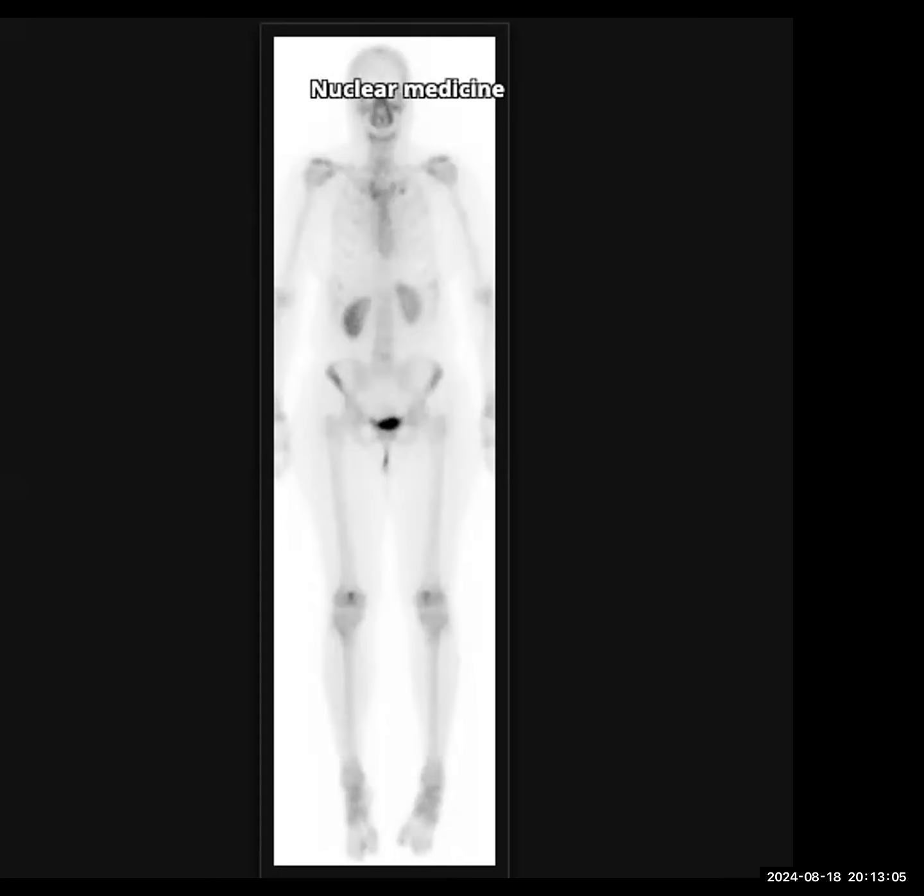That could be osteoarthritic changes. I can also see mild uptake within the iliac bones bilaterally. There is a small uptake that I see in the left-sided rib. Is this the same patient? Yes, no, it's a different patient. Okay. So I see a small uptake within the apex of the left hemithorax. You can ignore that.